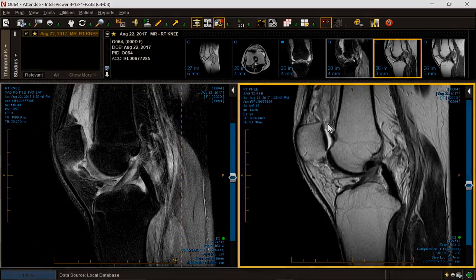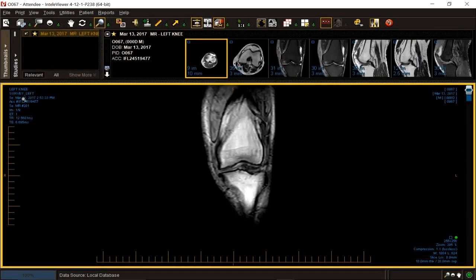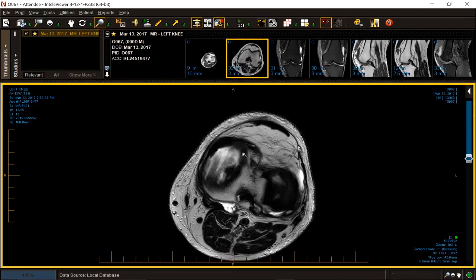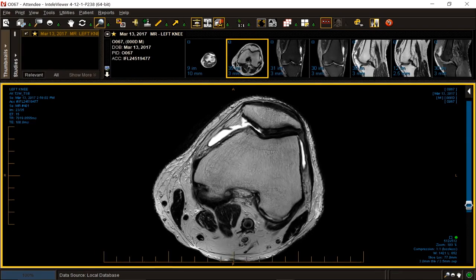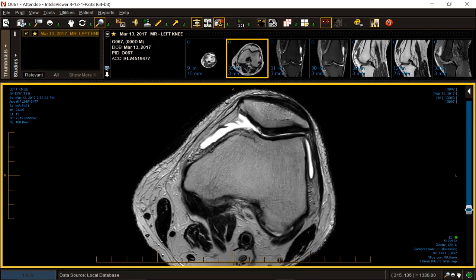Let's do another one. Anteromedial pain for 1 month. Weakness, evaluate for medial meniscus tear. Patient is born in 1951. 66 years of age. Okay, let's start out with our axial. Anteromedial pain. We have a deep ulcer in the apex of the patella.